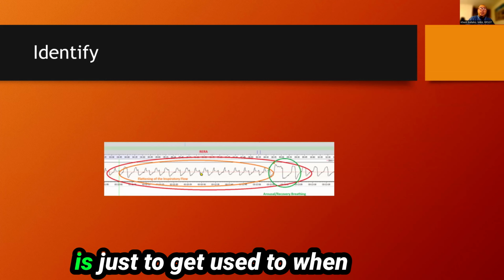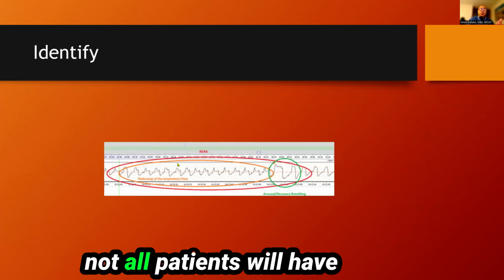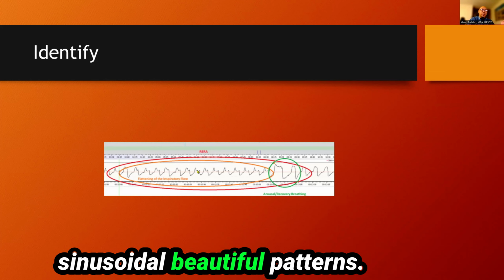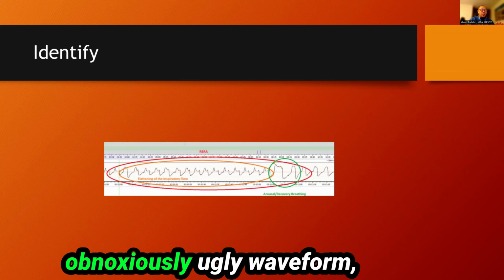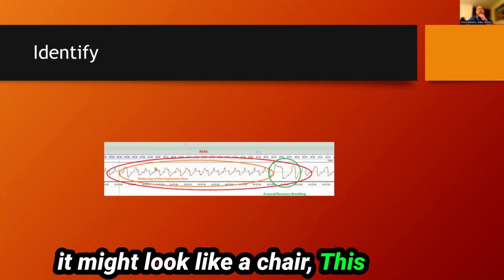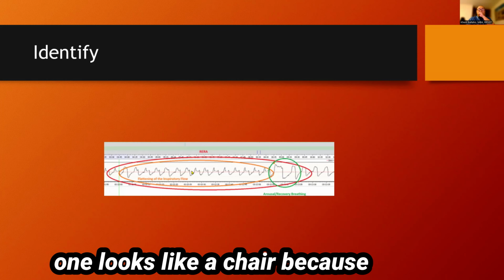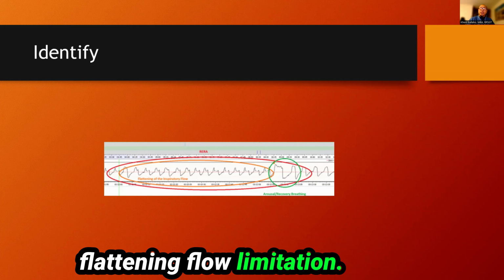But the whole point here is just to get used to when you see something that's not sinusoidal, because not all patients will have sinusoidal beautiful patterns. You'll be dealing with flow patterns that are just obnoxiously ugly waveforms. But when you see things like flattening or a mixture, it might look like a chair. This one looks like a chair because it's worse than a typical flattening flow limitation.